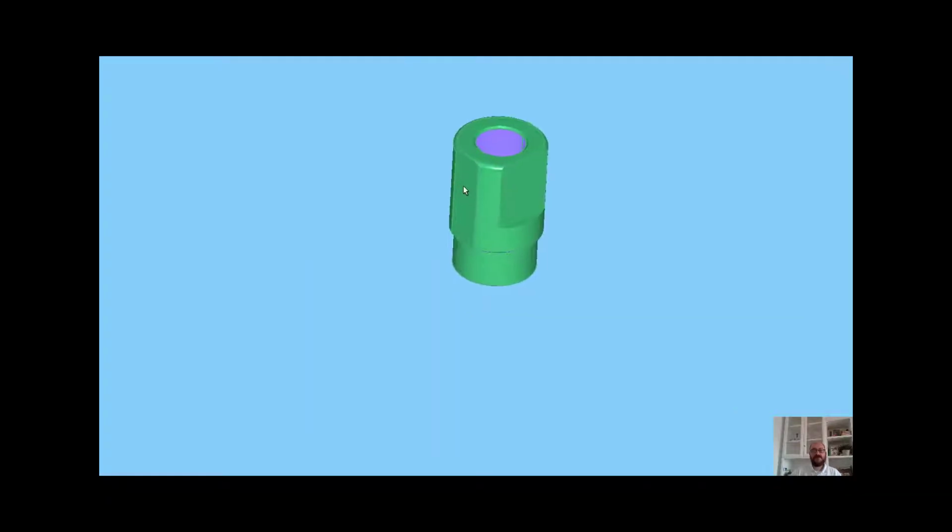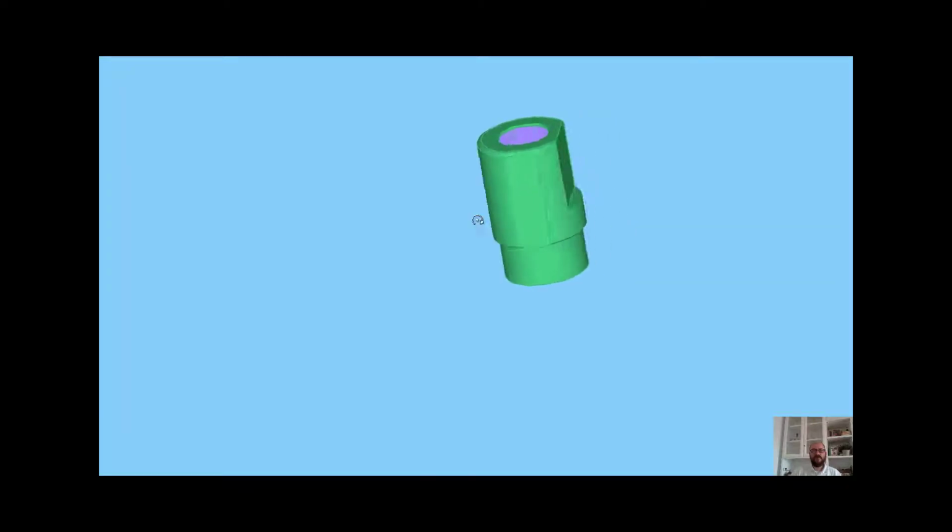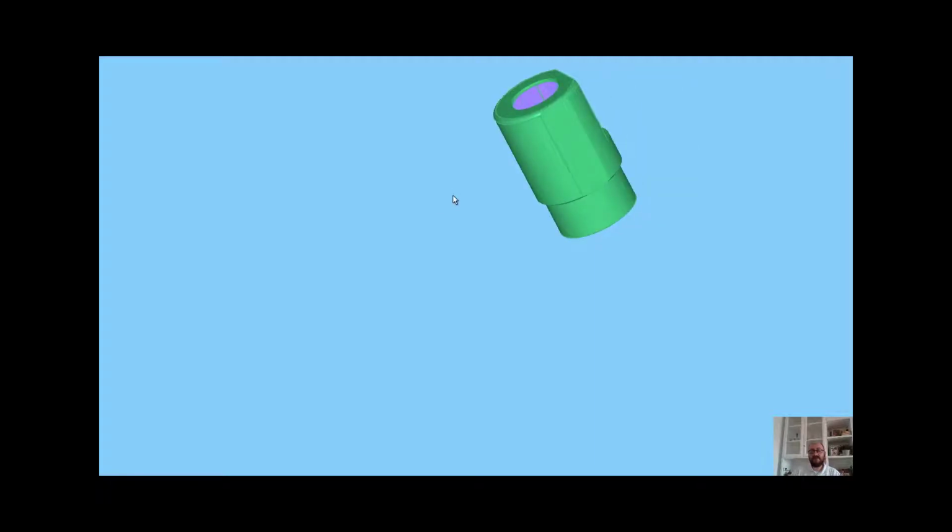On this digital surface, I would like to define the cylinder, a geometrical cylinder, for getting the implant axis. For doing that, there are different ways for getting this result. My way is to delete what I don't need, like in this case, to create a cylinder, a geometrical cylinder, starting from the highlighted surface.